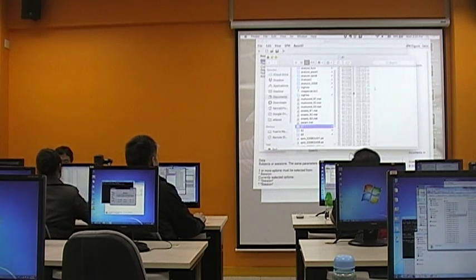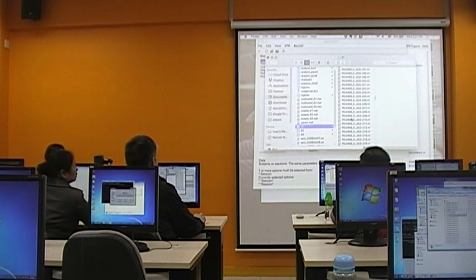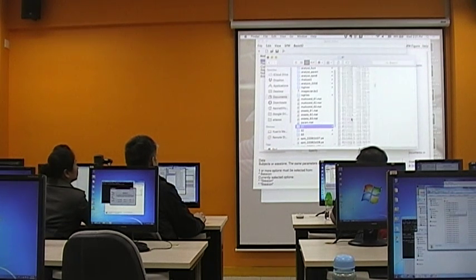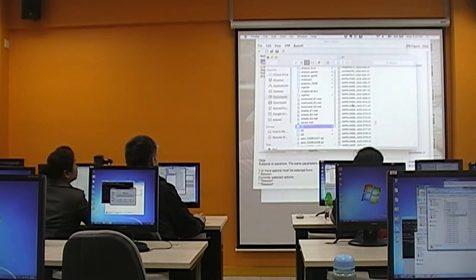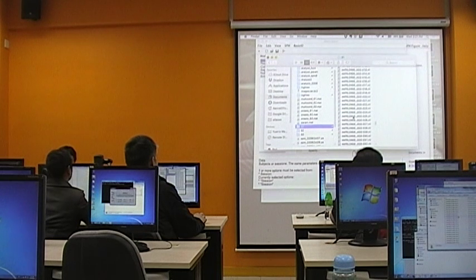And then we use this as a basis for head motion correction. After that, because we are not writing out new sets of images, we are only changing what we call the header information of these files. So you won't see any new files until the point that we write out the normalized images. The normalized images would add a prefix of W, which means warp.